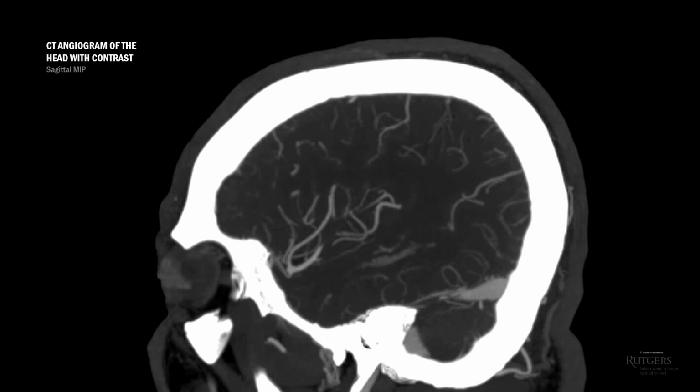Reconstructing the CTA in the sagittal view finally allowed us to visualize the right M2 occlusion. This patient was treated with IV TPA at an outside hospital, and by the time he arrived at a comprehensive stroke center, his deficits improved nearly to baseline and thrombectomy was not offered. But the point here is that CT perfusion helped identify the medium vessel occlusion.